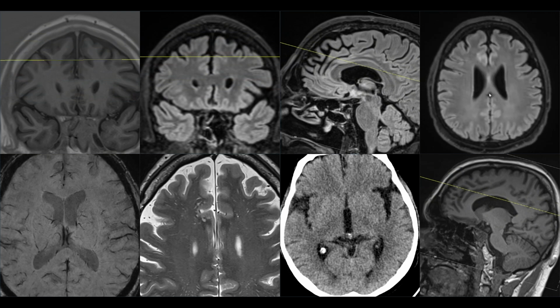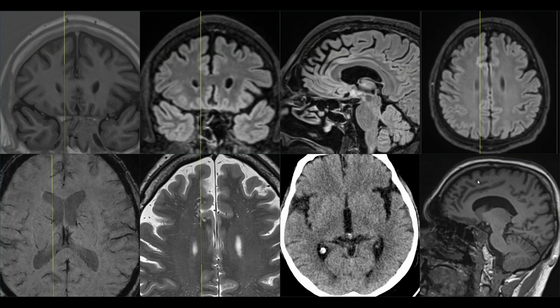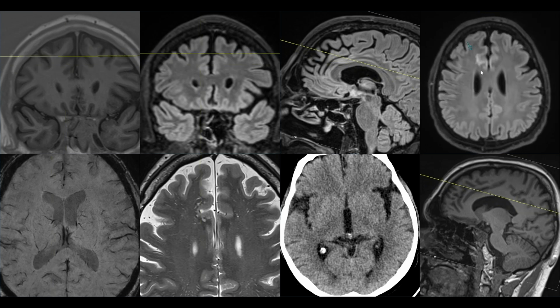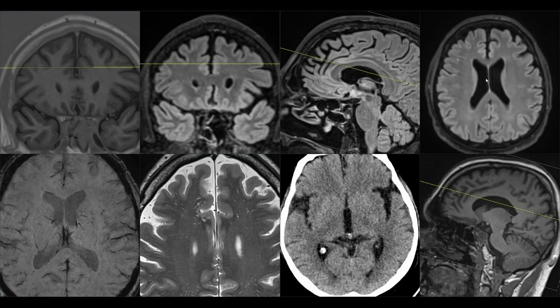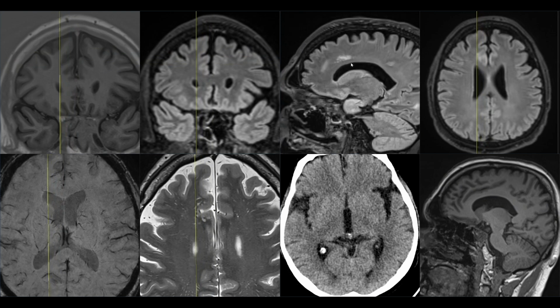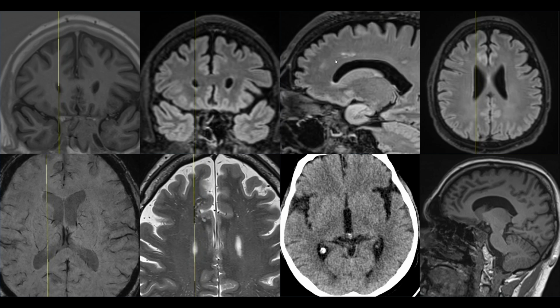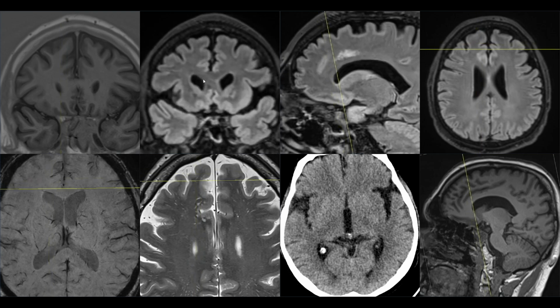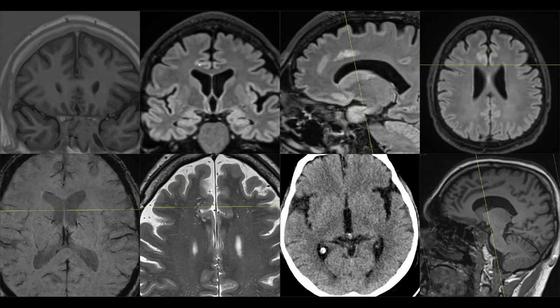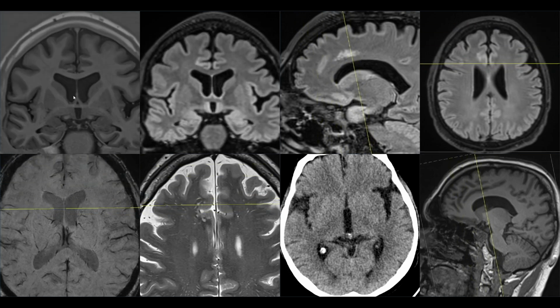What we noticed was changes located juxtacortically in the area of gyrus cinguli that show higher signal on a FLAIR sequence, appear to have a microbubbly appearance with very tiny bubbles juxtacortically. There is no perifocal edema. There was no contrast enhancement.